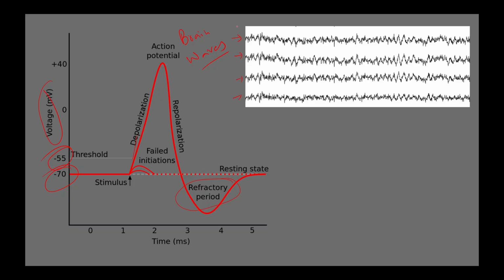Let's say this is channel C3, this is C4, this is CP2, this is CPZ or something. Don't focus too much on the naming of the channels. We will see how we do this naming. And this shows how amplitude varies with time. So this is the typical EEG, how it looks.